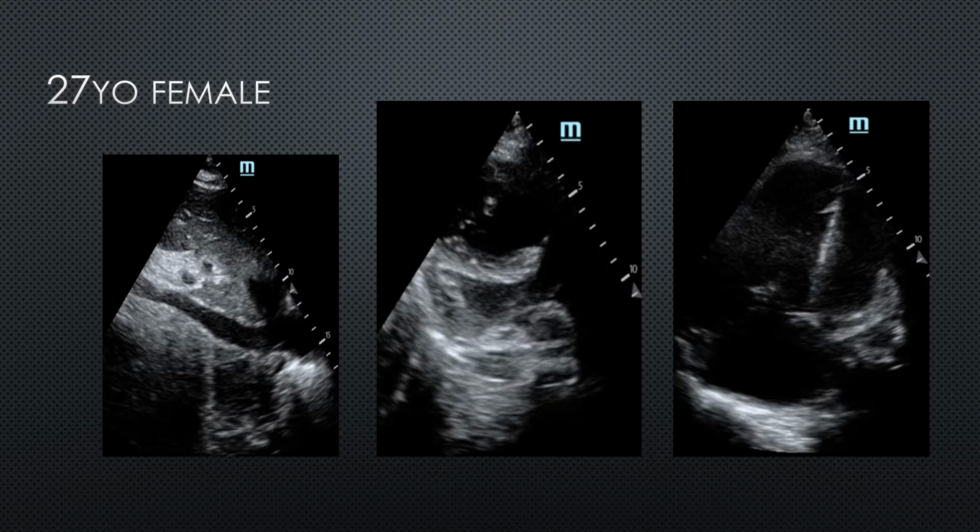In that first case, it may well have been chronic RV dilation, so we needed to know if that patient had any comorbidities. Perhaps they had chronic lung disease and they had chronic RV dilation and cor pulmonale. But in this second case, the young healthy patient, given it's a classic history of a PE and she's got RV dilation, there's not many other things that would cause that RV dilation. So if she was too unstable to go to a CT, then yeah, you can go ahead and thrombolize her.